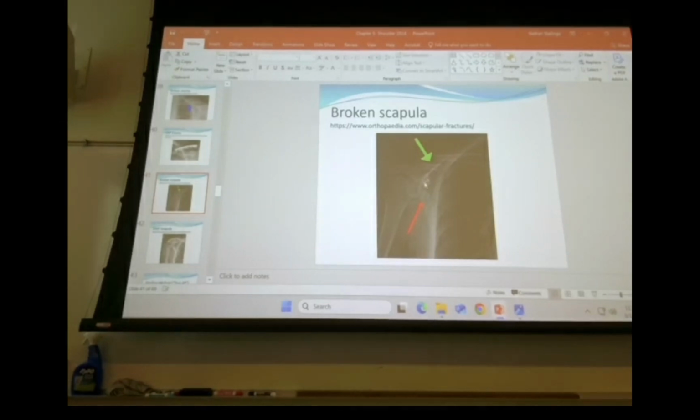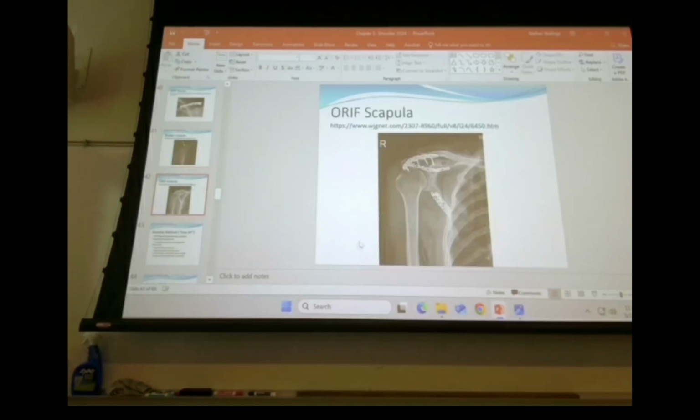I can't imagine this thing is, pretty messed up. I can't imagine how much positional pain this patient's going to be in. So again, you might want to take a look at this patient before you lay him down or stand him up, especially before you lay him down on that. Positional pain is just terrible with shoulder injuries.